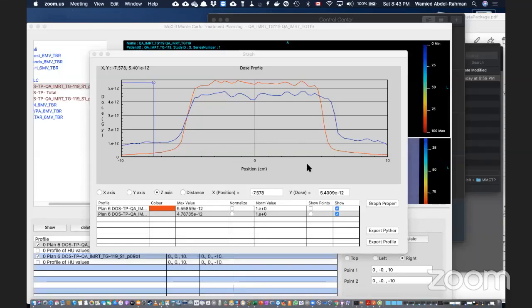Right, yeah. Okay. And I checked it several times. I don't know why I'm getting this gap. This is probably around 1 cm. This is 1, 2, 3, 4, 5. Yeah, this is roughly around 1 cm, I would say. And I have no explanation for this problem.